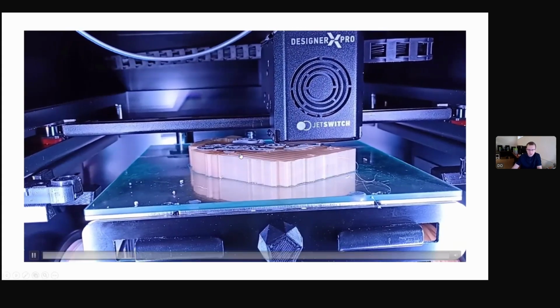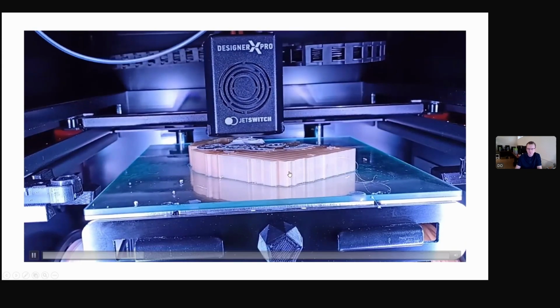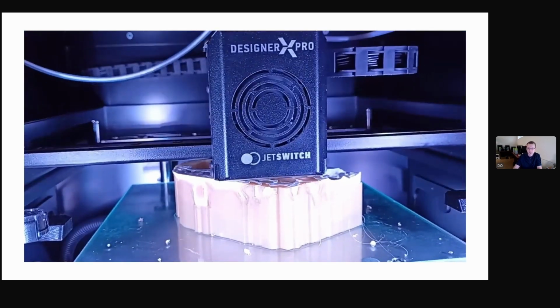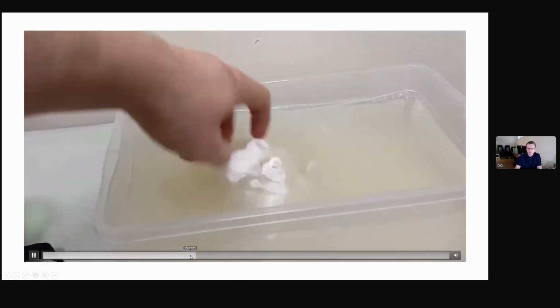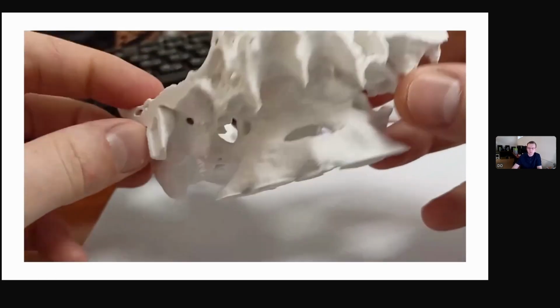You can see that this model is from polylactide, and the supports are from polyvinyl alcohol, PVA, and it is easy to remove them, just place the model in water.